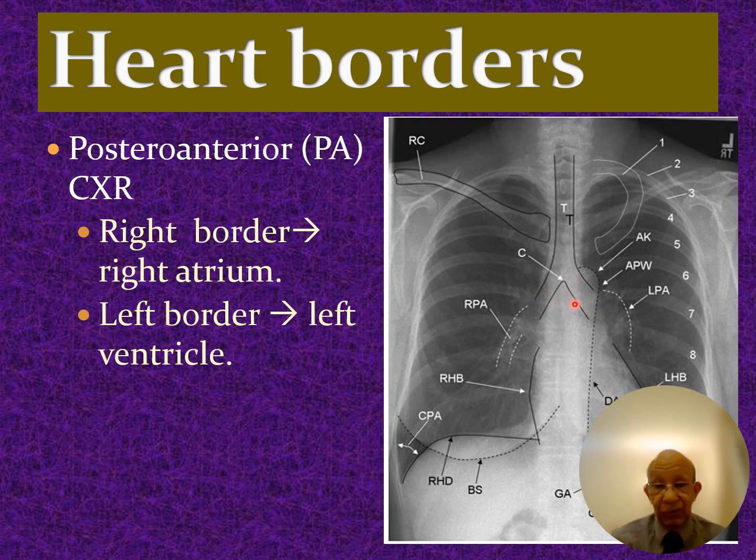An important rule is that this carina should be less than 90 degrees. The trachea is usually central, so this is another rule. It's usually central, but might be deviated slightly to the right. This is the right pulmonary artery. This is the left pulmonary artery. This is the aortic knuckle, on the left side. The space between the aortic knuckle and the left pulmonary artery is called the aortopulmonary window.